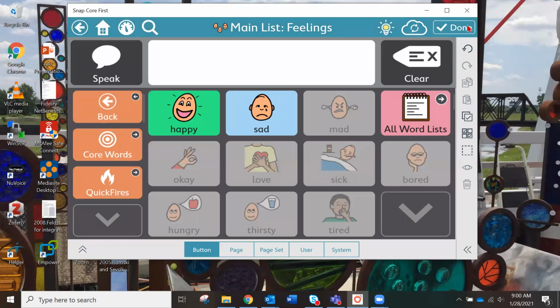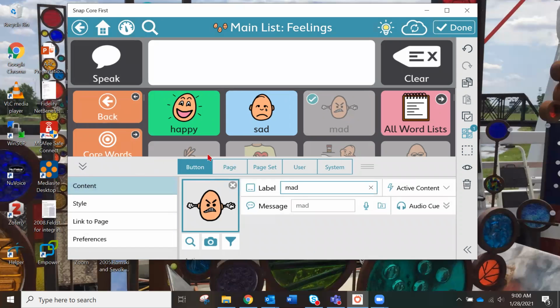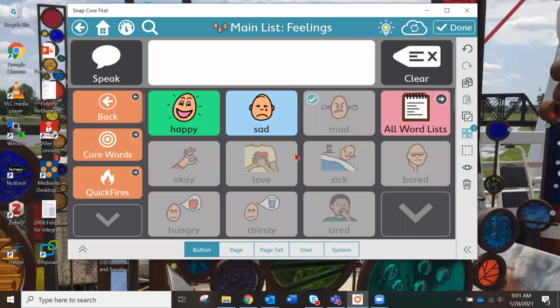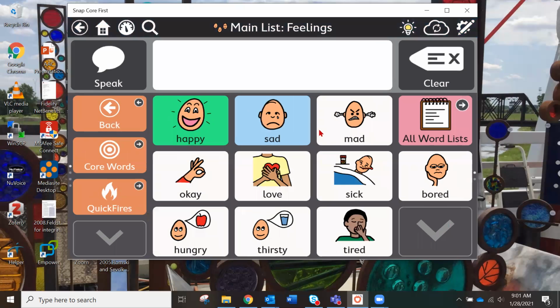You probably can do this quickly by now, but I'm going to click on my pencil, my multi-select tool, and I know I selected my multi-select tool because it changed colors. And then I'm going to start selecting the keys. My programming button little screen got in the way here, so I'm going to minimize that by clicking those down little carrots. I'm going to keep clicking all of these ones that have been hidden, and I'm going to touch the eyeball to say, show them to me again, and done. And now I have them all back and showing for me to use.